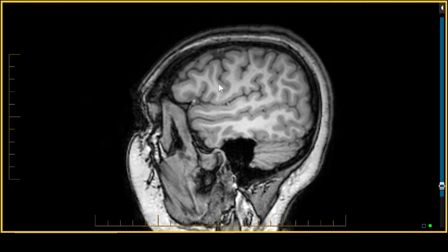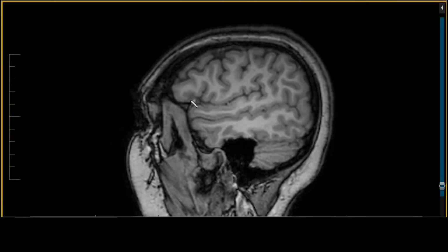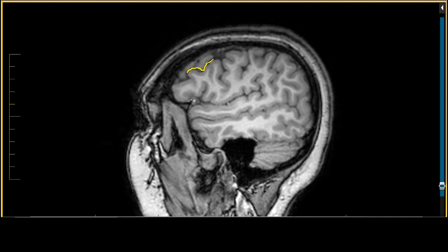Now just above that, we've got the inferior frontal gyrus and the inferior frontal sulcus. Now if there's an inferior one, there must be a superior one, right? Well, here's the inferior one. Let's draw over it, the inferior frontal sulcus. And if we kept going and we scrolled inward and we weren't volume averaging against the direction of the sulcus, we would see another one, the middle sulcus, and then another one above that, the superior sulcus. We'll see these in the coronal projection much better.